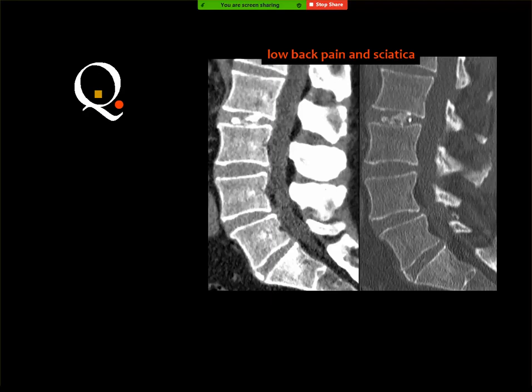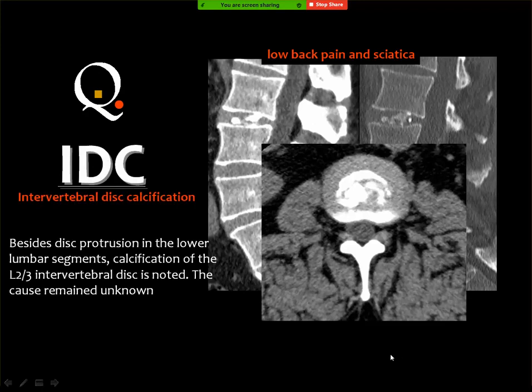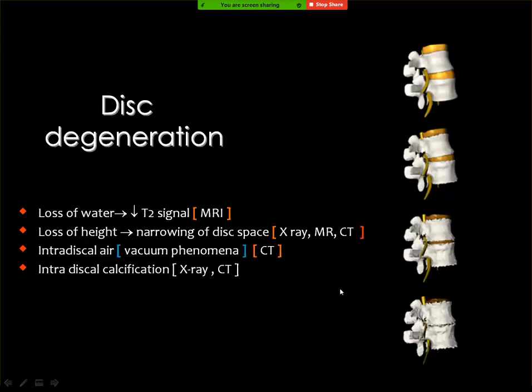Calcification, intra-articular. Yes. Disc replacement. Disc space cage? No. This is just calcification within the disc. There is no surgery, and this is just calcium within the disc itself. Actually, you know that I have mentioned that disc degeneration passes into 3 stages.